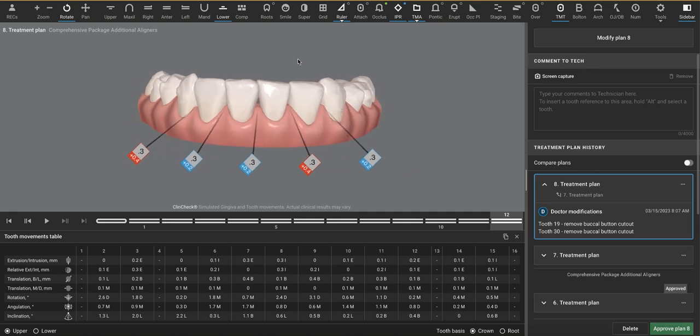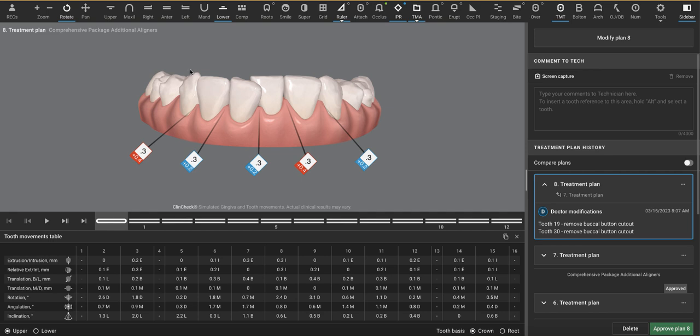So that's pretty much it. I think this will be a relatively quick case. I wouldn't try to do this in just 12 trays. I like the idea of refinements. Educate the patient on a potential posterior open bite based on the fact that she's relatively trapped already.